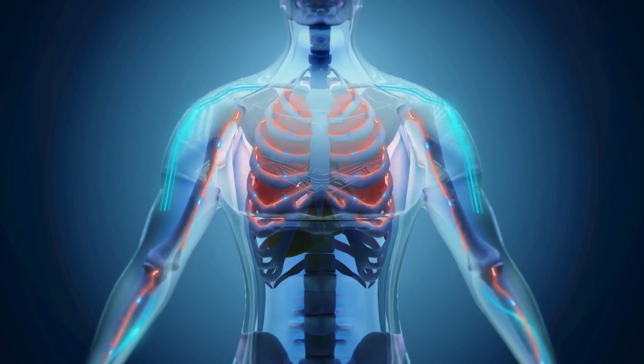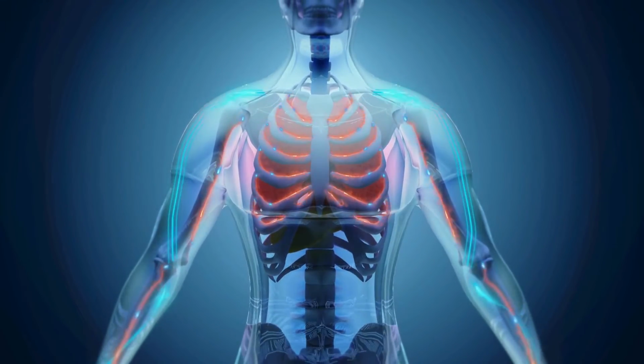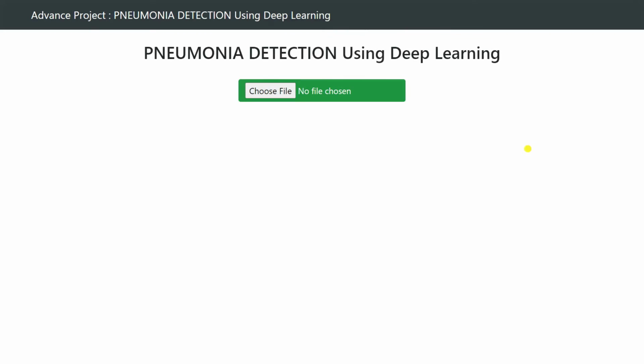In this video, I am going to be discussing pneumonia detection using deep learning. So let's see the demo first. That's our demo application.